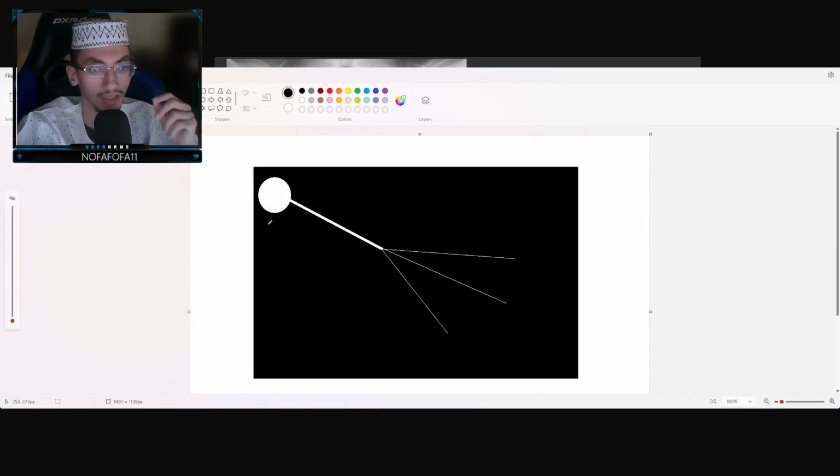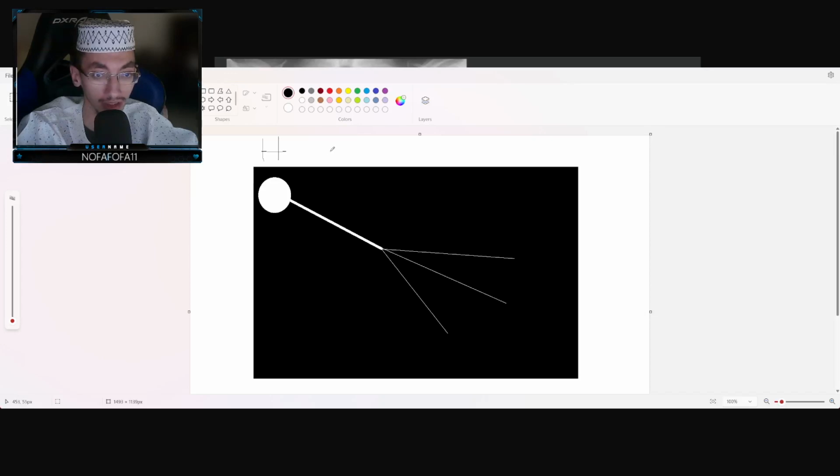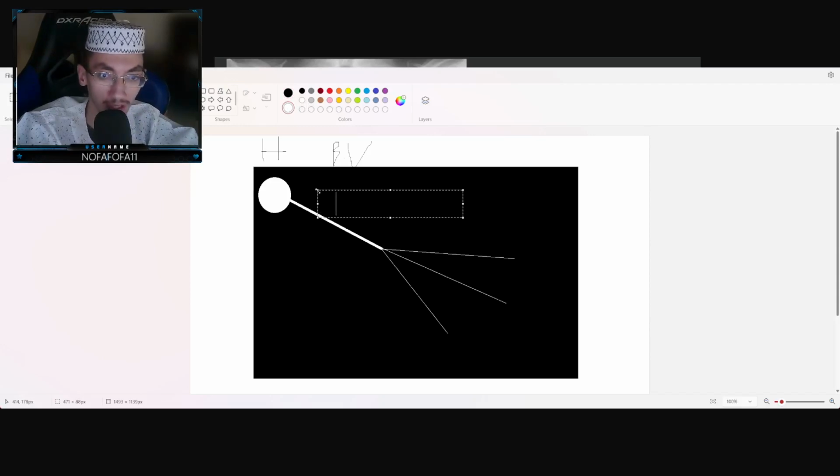Now, when I look at the hilum, I can see a blood vessel spreading out from it. It's spreading out in this picture right here, right? We have a blood vessel right here. I could pretty much draw it. And when I draw it, you'll see that this is the blood vessel.